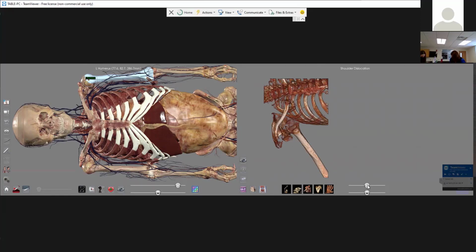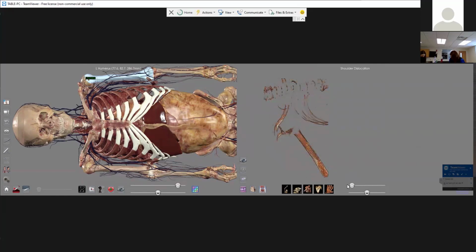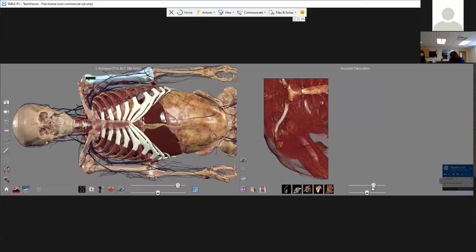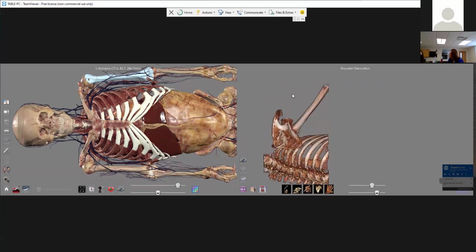And then case libraries also have these slider bars, which are more so like density. So you can see as I pull it back, we're really only seeing the densest part of the body. And as I pull it forward, we're getting more and more dense, whereas now I have muscle, which I don't want. So you can adjust it. The bottom one is more of a fine tuning, so I could use the small one to fine tune out. And now I can see this 3D, it's a CT scan of an actual patient that's now rendered.